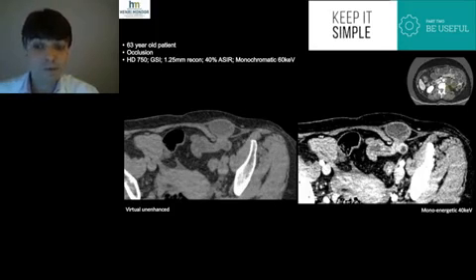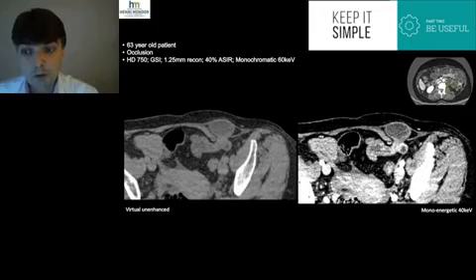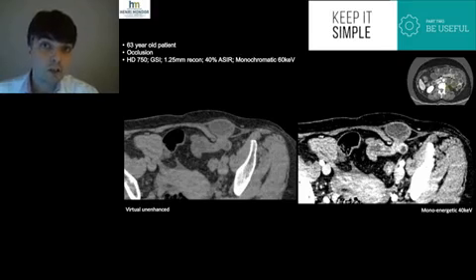This is provided from the same acquisition. This is the virtual non-contrast unenhanced phase, which is reconstructed from that phase. Again, using the same principles of material decomposition, getting rid of the iodine within the images, and making sure that what you do see which is enhancing is not a spontaneously hyperdense bowel wall, but it's actually enhancement within the bowel wall. So, with that, you can get rid with confidence of the non-contrast phase and actually demonstrate that you can reduce the X-ray exposure in those patients in whom you absolutely need a non-contrast phase for optimized management of the patient.